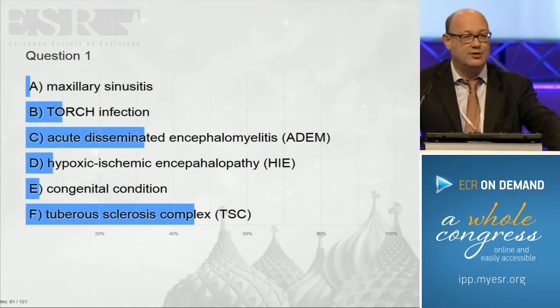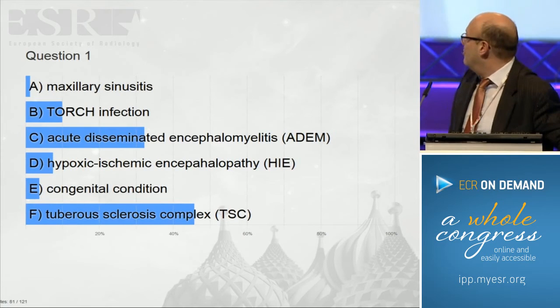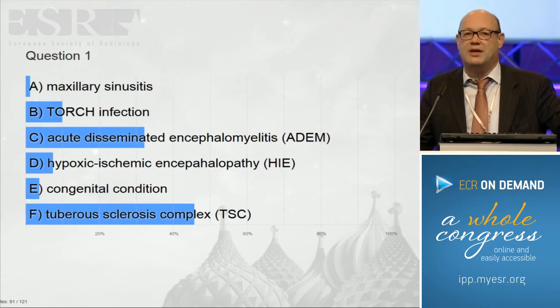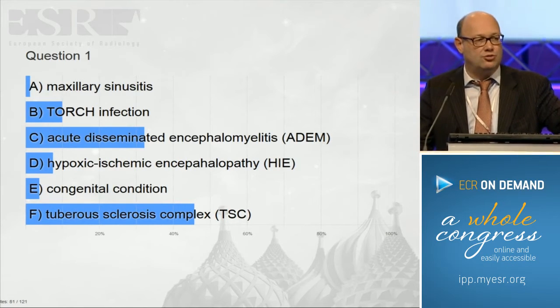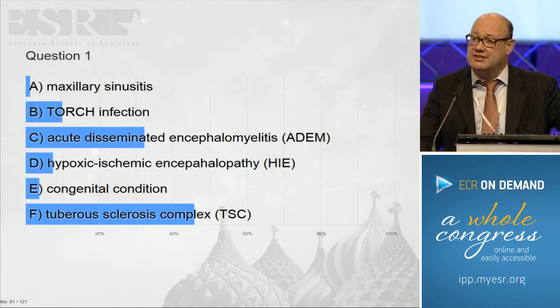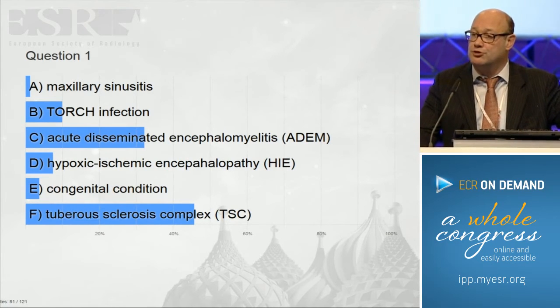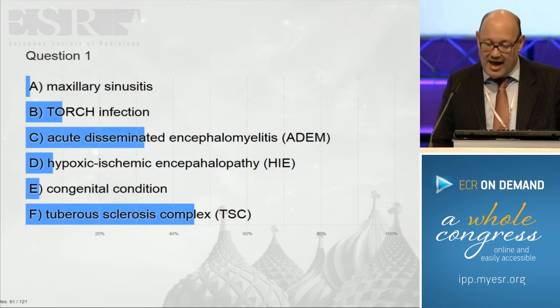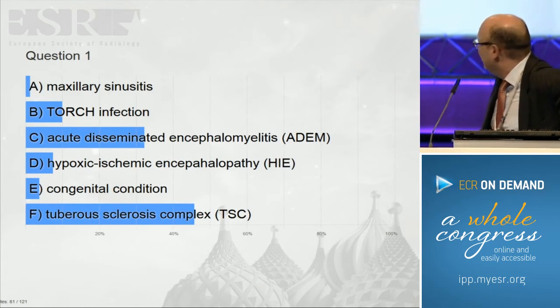Excellent. I think you all had a very good sleep this night. As most of you brought up, this indeed is a case of tuberous sclerosis complex. And actually, it was just this infection to the lungs and his seizures that brought him to the CT scan. And so this was the first diagnosis of the tuberous sclerosis complex. As you might know, in tuberous sclerosis complex, typically these children are having seizures, and this goes with the diagnosis.